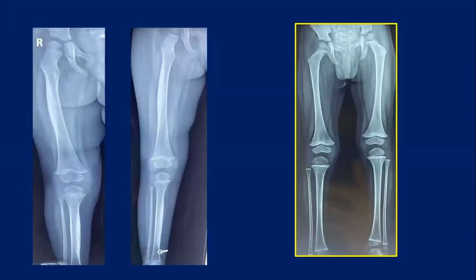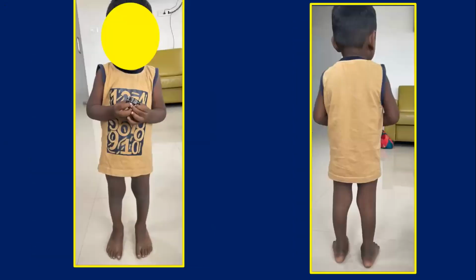Let's move ahead. And this was after vitamin C supplementation. You can see the organized periosteum now. Excellent. So the hematoma which was there subperiosteally is now organized on both the femur as well as the tibial side. And after 1 year, you see the X-rays, they are all normal looking. And the child started weight bearing and he was all fine.